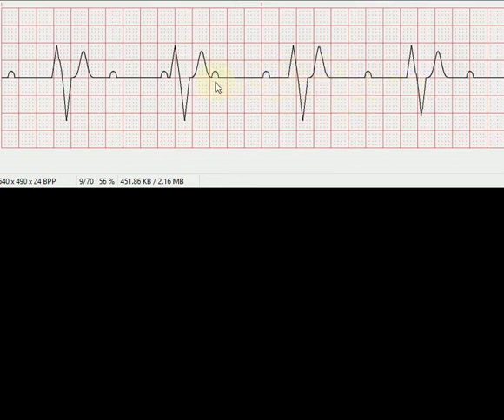And honestly, if you map this out, this is another kind of cool thing that I'll show you real quick. It's about 3 blocks between the P waves. So if I come over here, 1, 2, 3 blocks, look at this T wave. It's taller. See, that one's 2 blocks below the line up here, and this one goes almost to the line. That's another P wave that's hidden right at the top of that T wave. You wouldn't have found that unless you knew to look there, but what's neat about this is you don't need to find it in order to determine what the rhythm is.